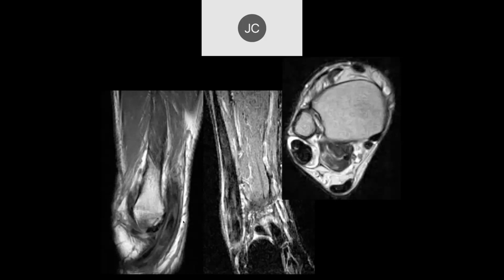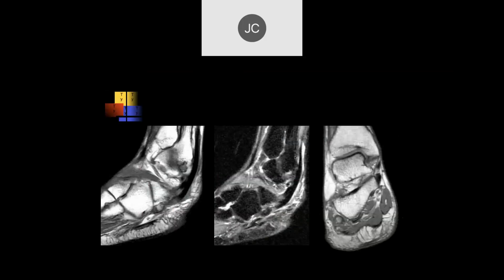Okay, Tayson. All right. Looks like we have a severely tendinotic peroneus longus tendon. Yeah, so this is a very diffuse injury all the way along the course. Right. Yeah. Okay. Robert?